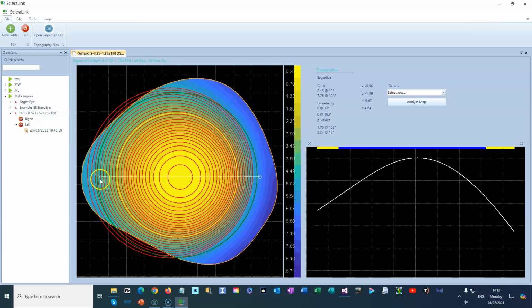Our twiddler is designed to be different. It has an X at this end and an O at that end. And on the height, on the profile graph, we have an X at this end and an O at that end. So you can see where you are in relation to the actual twiddler. So you know if it's this end of it or that end of it, which can be important because if, for example, I now rotate this to an area like that, you will note that I am now towards the X end, which is this one here.